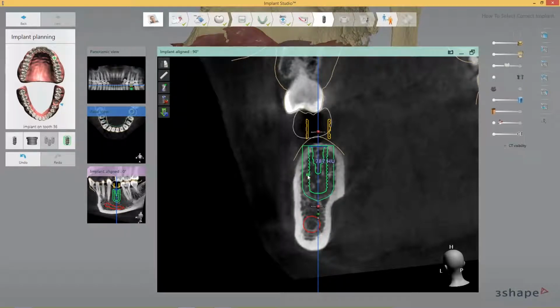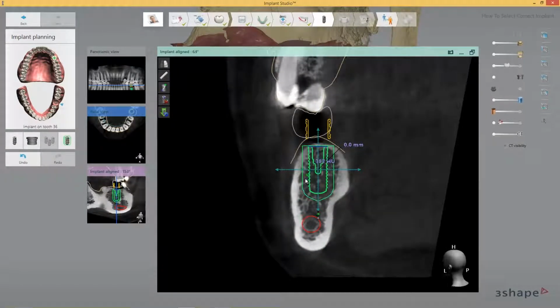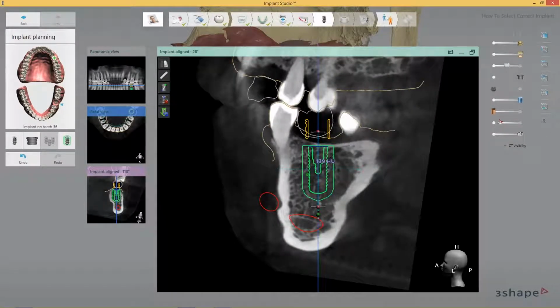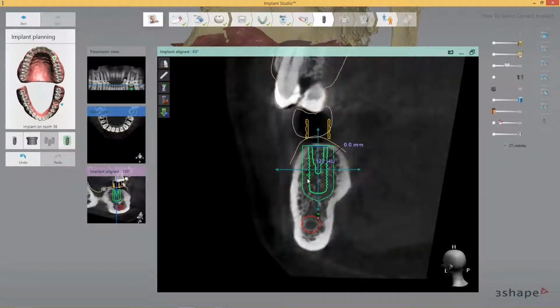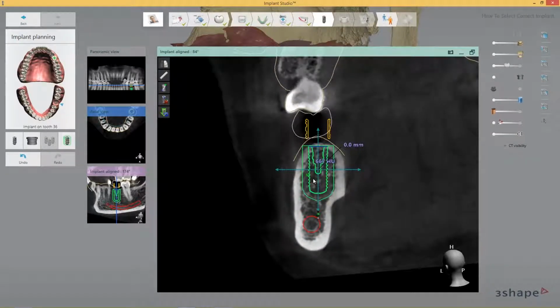And here I can see, but it's actually hard to see on the other side what is happening. So what I can do is actually I can turn around and see how the bone is changing when I scroll around the implant. So now the implant is in a locked position. I'm following the implant around, so you can see the bone changing. So I can see that there on the back side there is only 139, 85, 38, and then it goes up again. So one side of the implant has a very low density and the other side has a very high density.